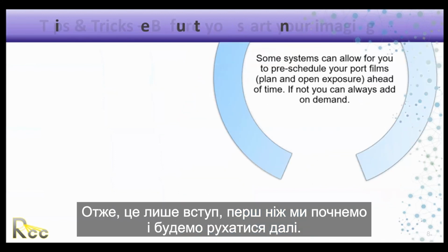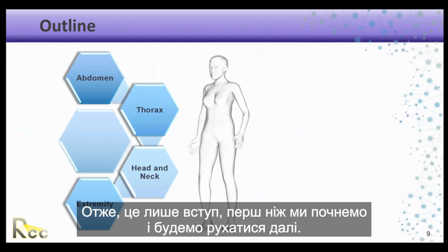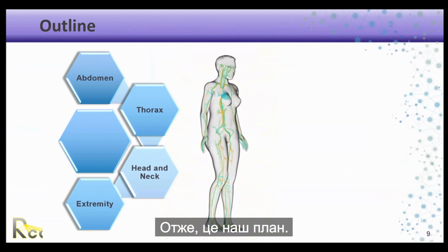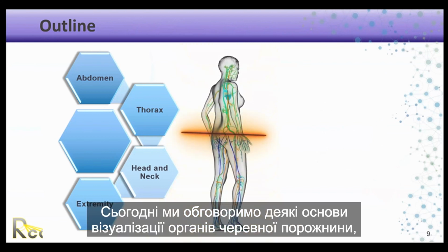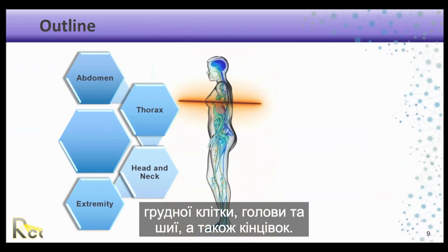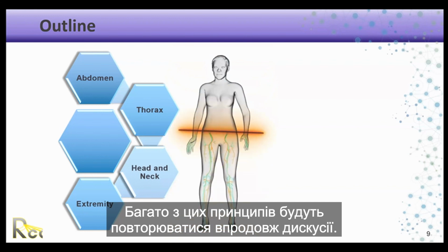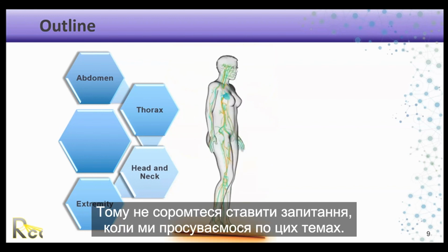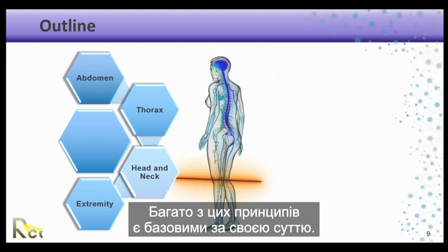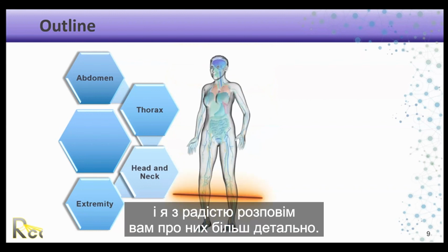All right, so that's just sort of an introduction before we start and move forward from there. So this is our outline. Today, we're going to discuss some fundamentals of imaging for abdomen, thorax, head and neck, and extremity. Much of these principles will be repeated throughout the discussion. So feel free to ask questions as we move through these topics. Many of these principles are basic by design. If you would like more complexity, just let me know and I'll happily go into more detail with you on that.